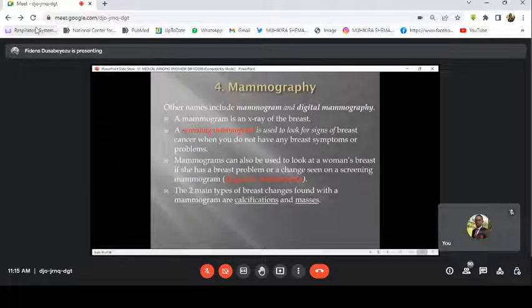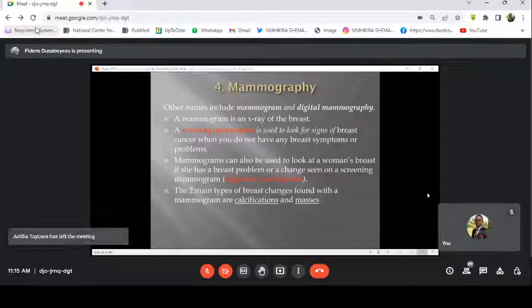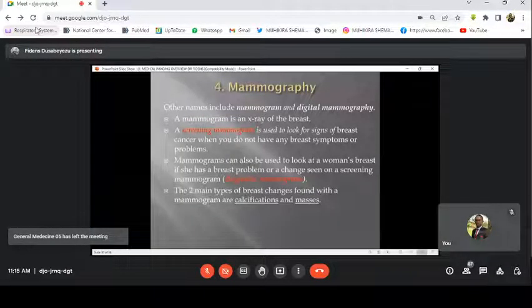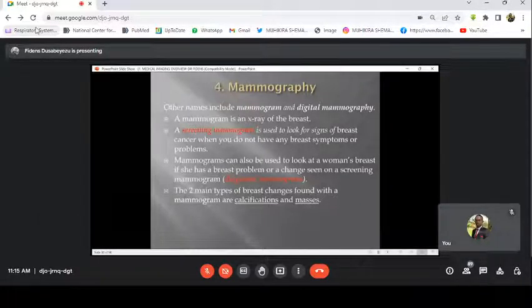All right. In the breast, mammogram can show either calcifications or masses. And here I can tell you, mammogram is always done with ultrasound of the breast, because you remember the densities I told you, different densities. When you see a soft tissue mass in the breast, you can't know if it is really a cyst.